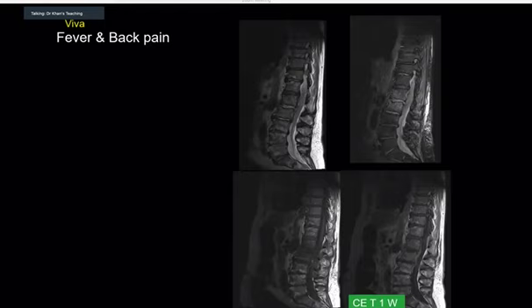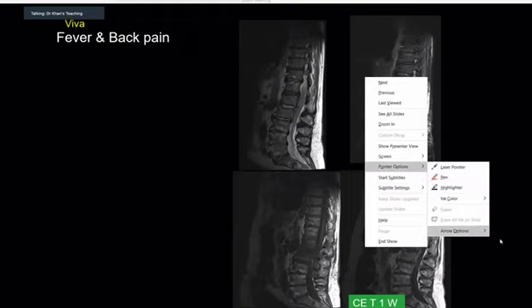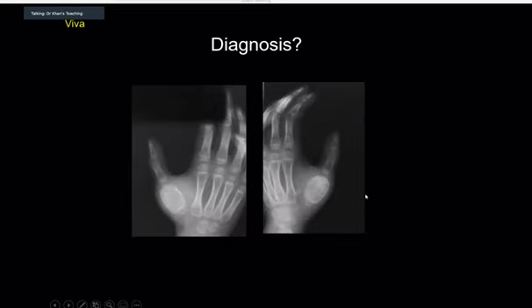And the clinical question will be, can you take a sample, put in a drain and things like that. And this is what I was telling you, that if it is not liquefied, then you cannot do that. So this is an aunt mini type of case. If you have seen it, you will call it. If you have not seen it, you will find it very difficult.